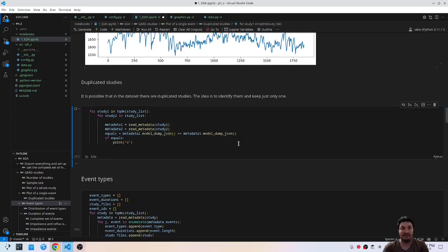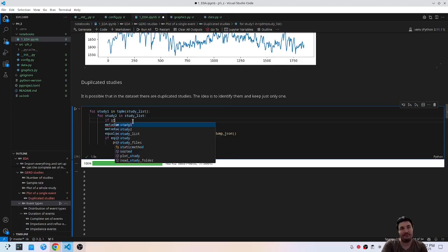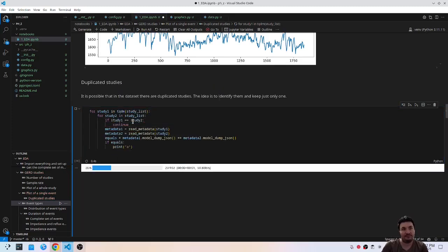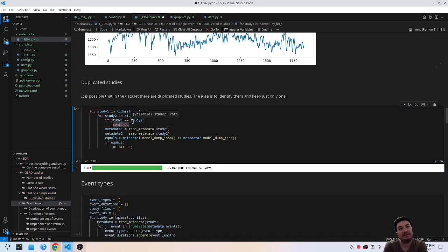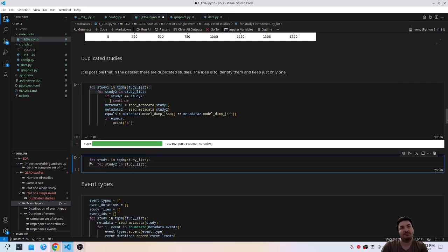If I do like this, of course, okay. It is possible that we don't have any duplicated. Maybe we don't have. Okay, let's see.